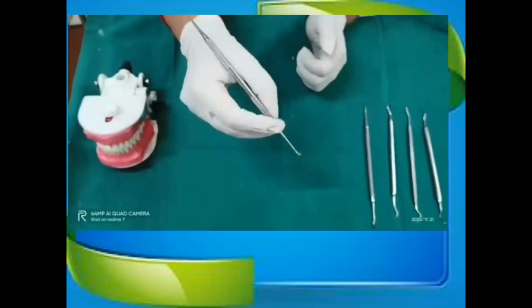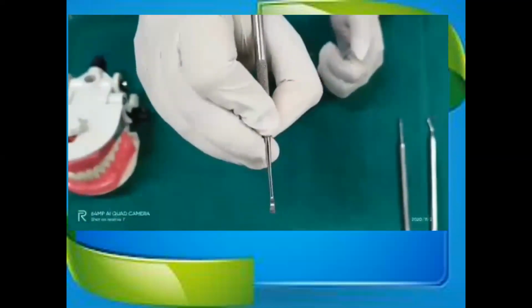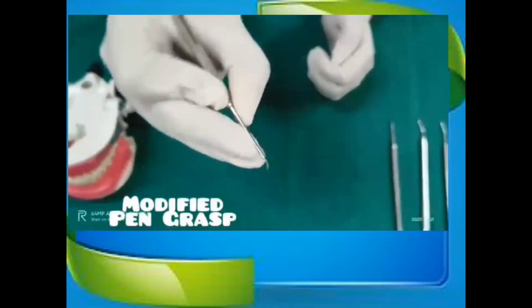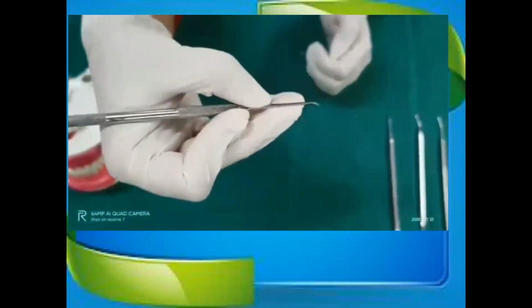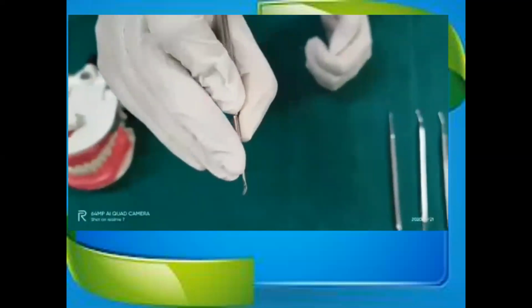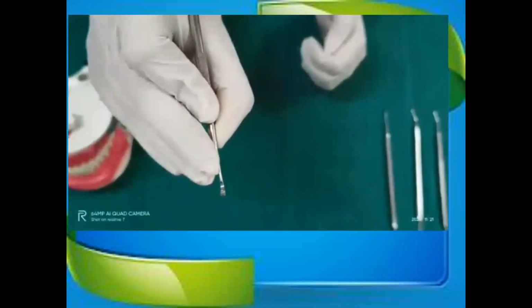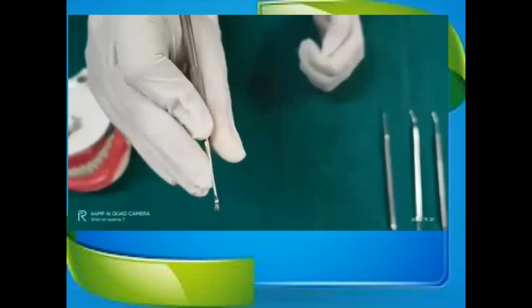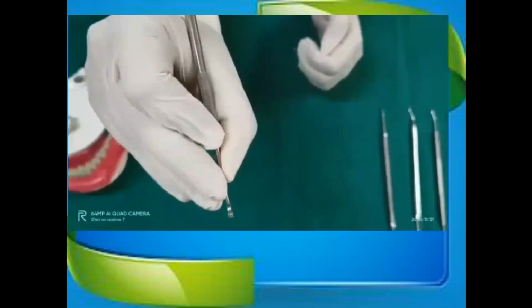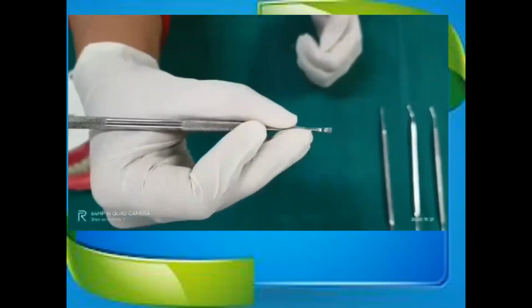Next is pen grasp. It is just like holding a pen. Third one is modified pen grasp, which is the most commonly used grasp. And in this grasp, you will place your middle finger onto the shank area of the instrument, like this. And the pad of the thumb is placed midway between the middle and index finger. The index finger is bent at the first joint, and the middle finger is resting on the shank area.